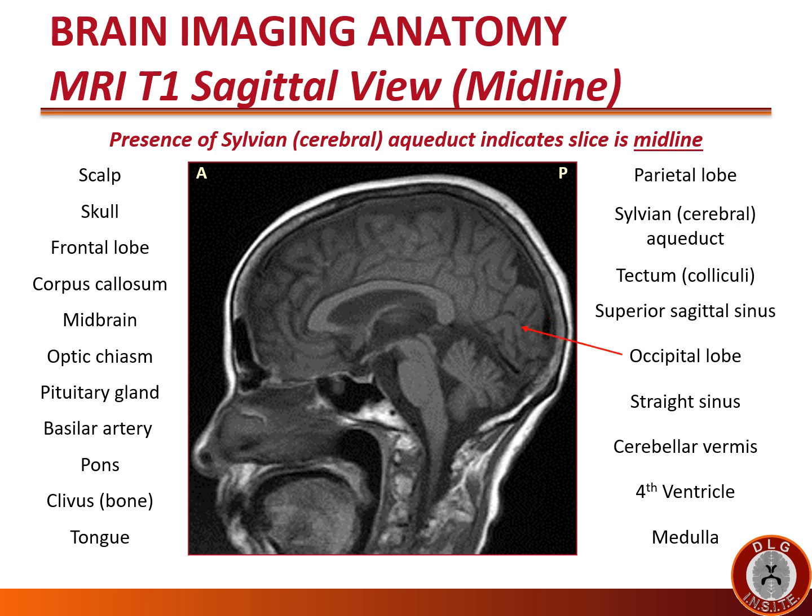The posterior inferior aspect of the cerebrum on the mid-sagittal image is the occipital lobe. It lies posterior to the parieto-occipital sulcus. The black tube running just inferior to the occiput and superior to the vermis of the cerebellum, running in the folds of the falx, is the straight sinus. This is a venous structure that drains the deep cerebral veins.